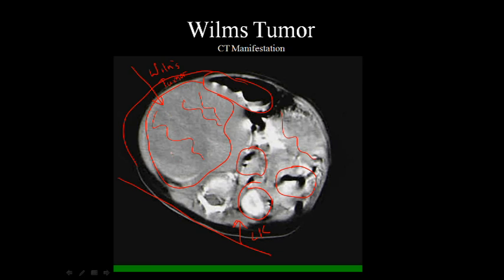Also, before we go into the next image, notice that this area is darker, this area is lighter. We kind of see that repeated with this area being lighter, darker, and this area kind of dark too. That is due to the differing degrees of contrast enhancement typical of a malignant lesion in the patient's body.